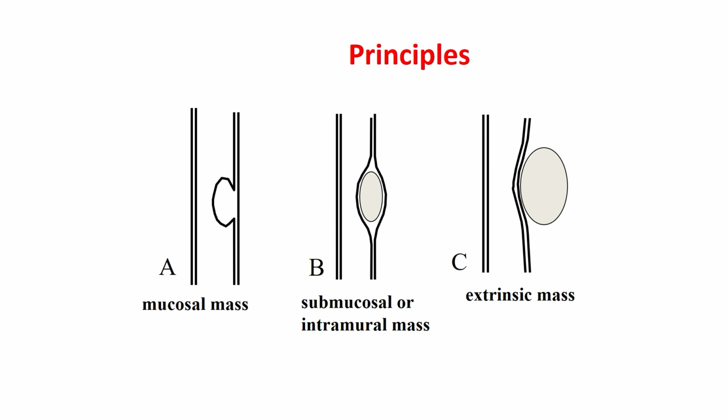Now, if you just look at this picture, you can see how the contrast media actually works for hollow organs. This picture shows a GI tract right from the esophagus down to the anus. If you see, there is a mucosal mass in picture A. In order to enhance the density of this mucosal mass, we can use the contrast agent, as it will line these areas, and the density will definitely be enhanced.